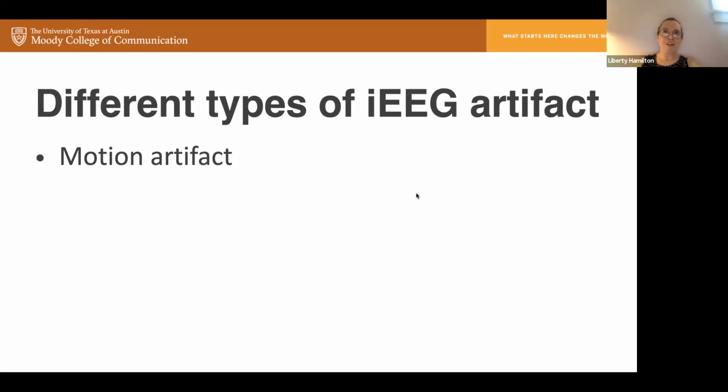I do believe, and I've been told by other researchers who look at electrodes that are maybe closer to the eye orbits, that sometimes you could get artifact from eye blinking, but you don't see the same kind of dips that you might see in EEG activity. You do see, if they move the cables, for example, sometimes people will shift in their bed and move around, and then you'll see this big low frequency drift. You also may see epileptiform artifact. And so those are some things to look for.